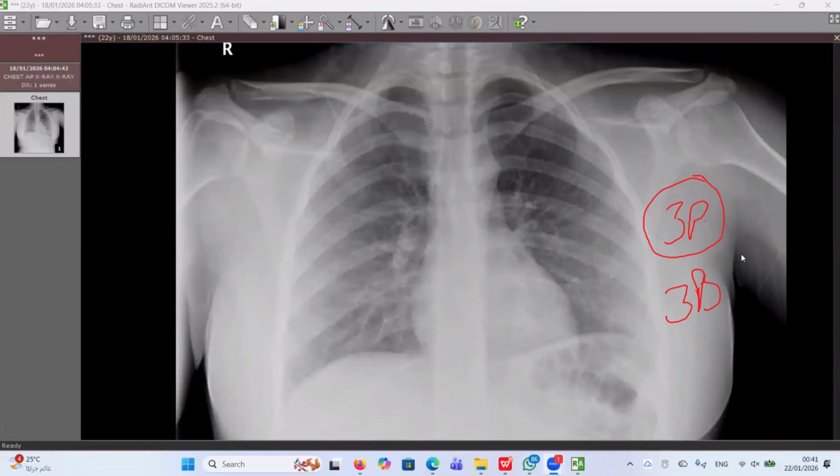Below the diaphragm, search for any gases in the liver, searching for any pneumoperitoneum, searching for any surgical clips for the adrenal gland, and all of these. I hope you got the idea. And I think all of you should have his own checklist. This is my own checklist. Maybe easy for you to apply.